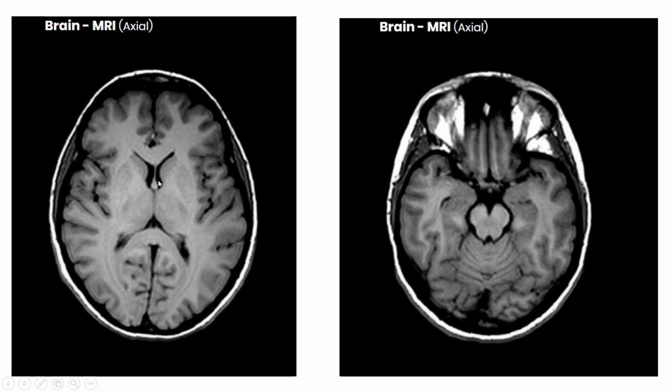So here we have the anterior horns again and the septum pellucidum, and then we have the foramen of Monroe on each side here, the right and the left, coming into the third ventricle. And then these are the posterior or occipital horns of the lateral ventricles, and we're going to see them come all the way back here. We're not going to see them on these images because, again, these are not the more detailed images, but you can just start to make out the posterior horn. So this is the trigone area here.